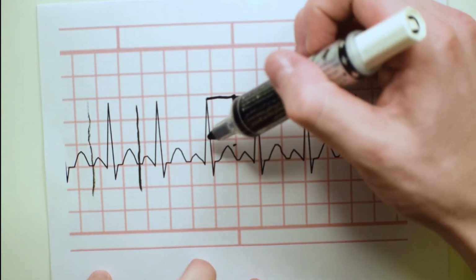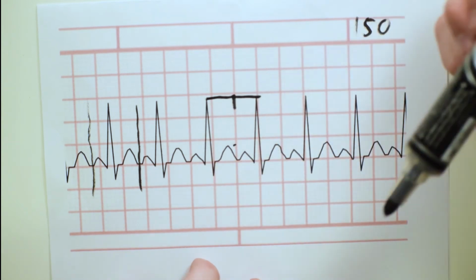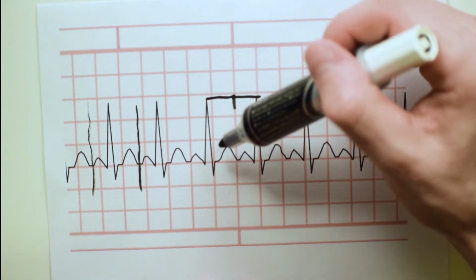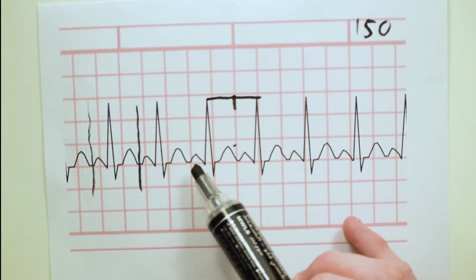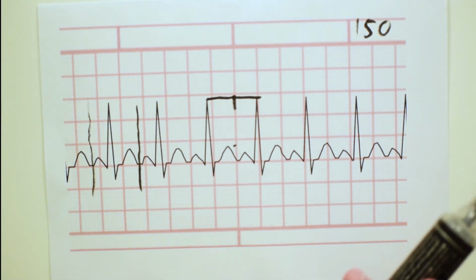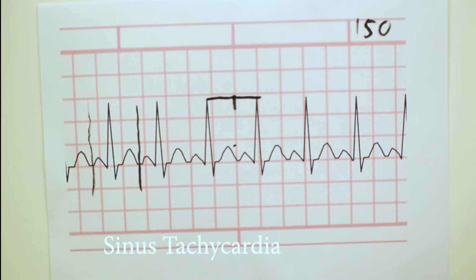So our T wave is normal, it's also not very big. If it's more than half the size of your R wave, it's considered big. It's always in proportion to the other waves. It's never like, well, it's 5 blocks high, so it's big. It's always in proportion to the other waves, generally the QRS wave. So we have a P wave, meaning it's coming from the sinus or sinoatrial node. So it is a fast sinus rhythm, so we have a sinus tachycardia. Nothing else really to talk about.